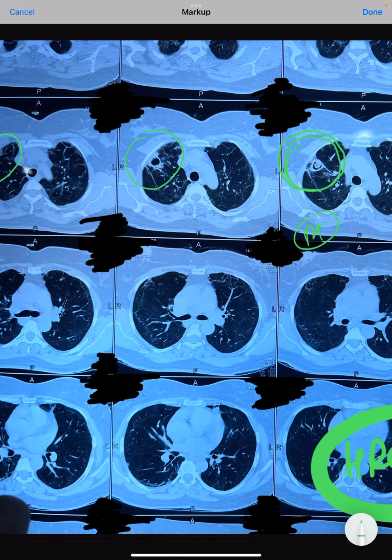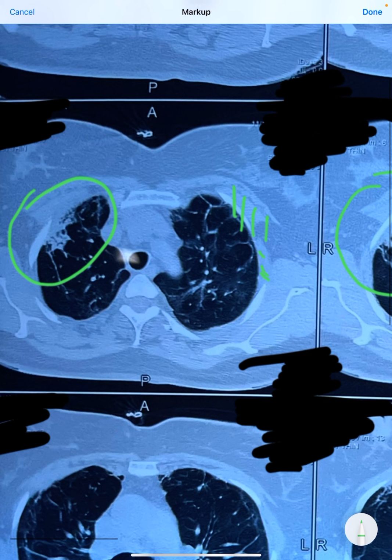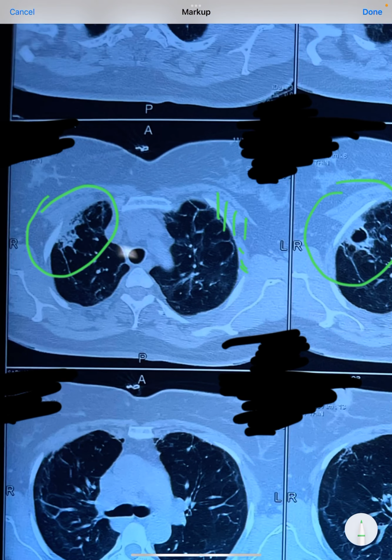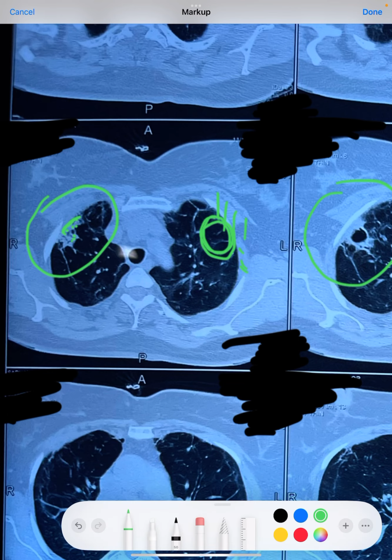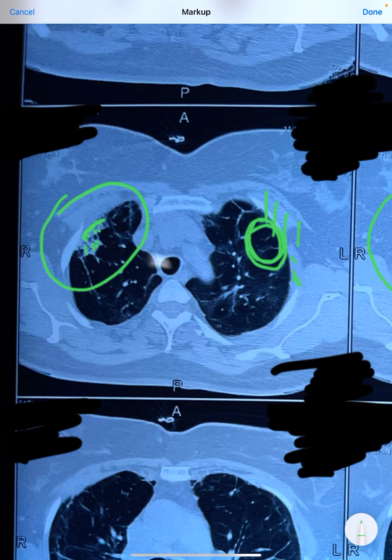So we know that whenever there are dense white fiber-like or line-like lesions in the lungs, it is usually always fibrotic bands. So we can see that this is very much hyperdense, white, and this is coming from the lateral part of the chest, which is not here at all. Here it is perfectly normal or okay, but here we have dense white fiber-like connections or lesion.